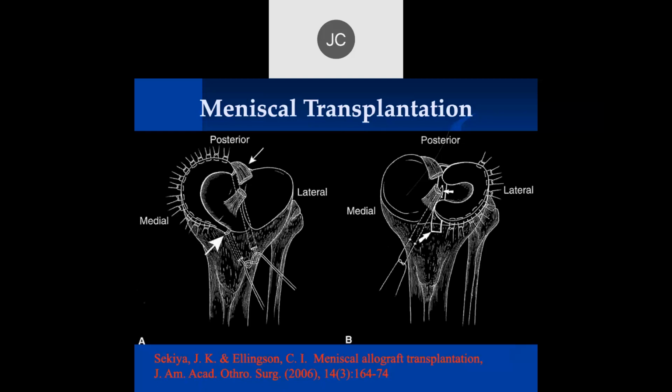Now, you can do that fine. Now, on the lateral side, it's hard to do that because these kind of placements will start interfering with the ACL attachment. This is on the lateral side. There is space over here on the lateral side where you can actually put in a bar here, which you can't do on the medial side, because if you try to put a bar on the medial side, you would impact the ACL insertion point.